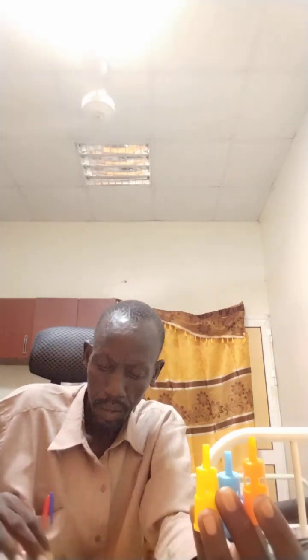And when you see in front of me here, look at this. Look at the colors. These are colors. They are called fixed orifice devices.